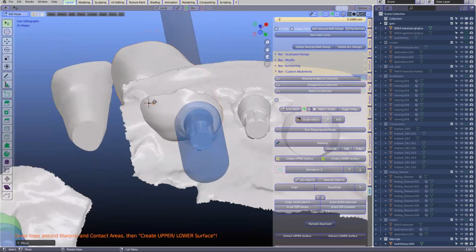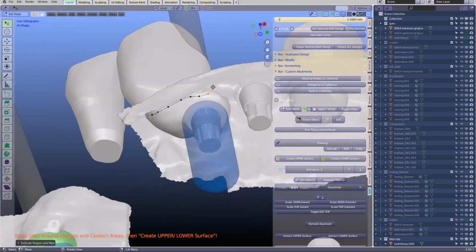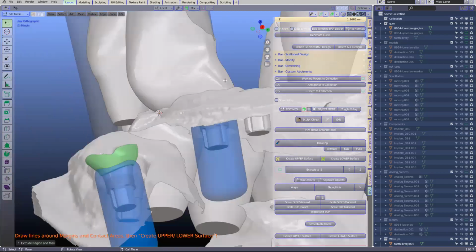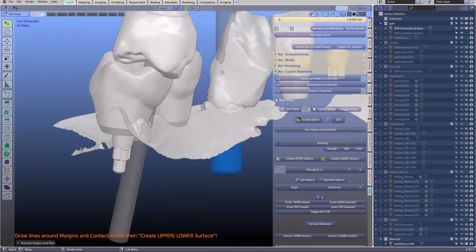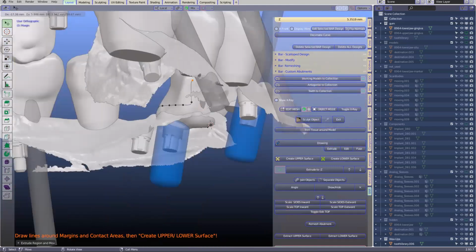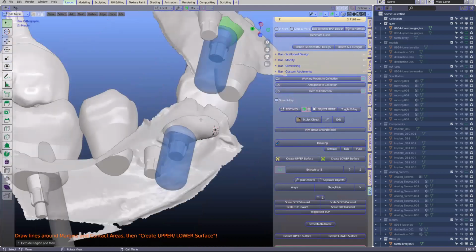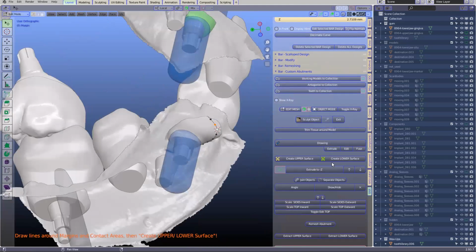Drawing. We're going to go above surface, like that. And then we're going to dip below surface again. Maybe a heat map wouldn't be a bad idea, actually.